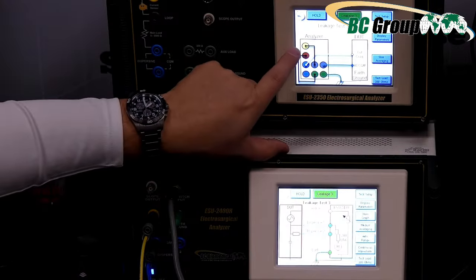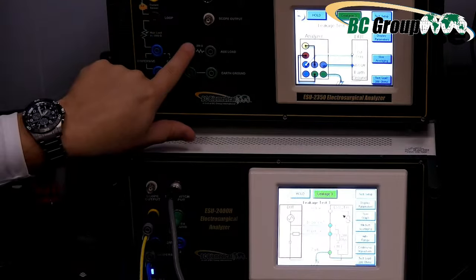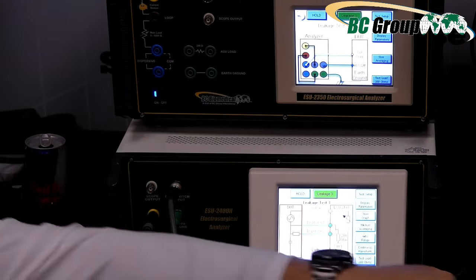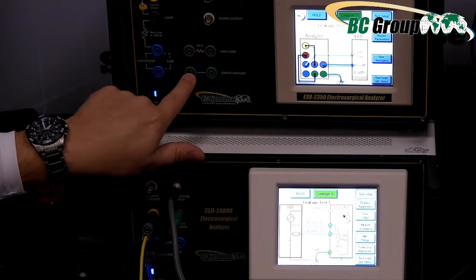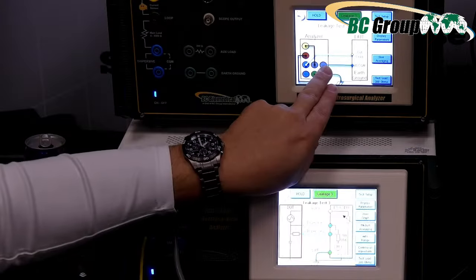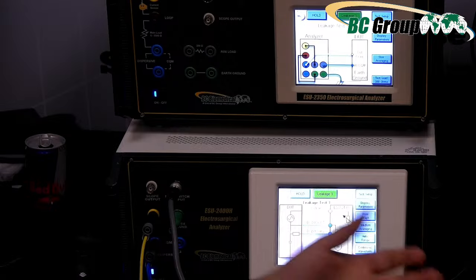Okay, so my yellow is supposed to connect down here. So it's supposed to go from here to here. And then this one right here is supposed to be my blue CQM. So that one's supposed to go back that way. And from the brown, I'm supposed to go down here to ground. So what we're measuring is the current to ground for a person, okay? And this one right here is supposed to be your yellow.